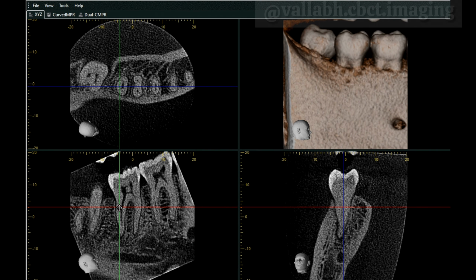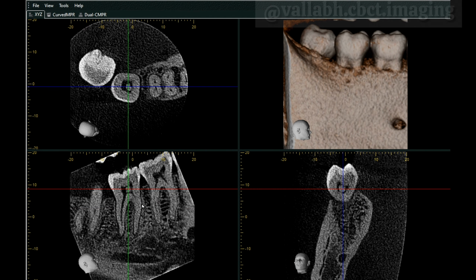Also note the presence of a suspected pulp canal stone. Pulp stones are nodular calcified masses. They occur either attached to the dentine or may roam freely in the pulp canal. They are irregular in shape and are made up of dentinal cells or degenerating odontoblast cells. The treatment includes proper instrumentation while performing the root canal, and care needs to be taken while removing the pulp stone.